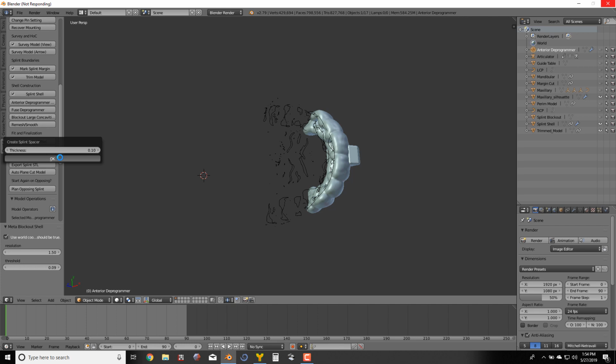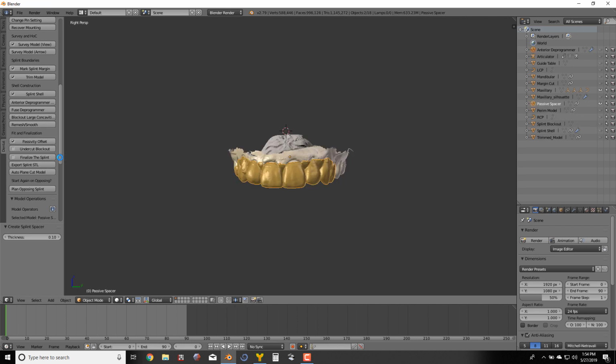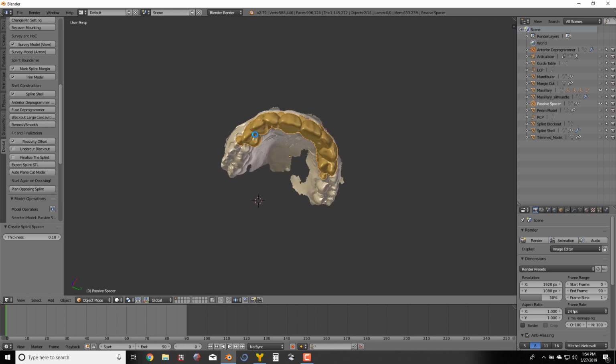But she has pretty good length of teeth, so I'm just going to leave it where it's at. But yeah, if you're going to be using this software, don't have Mesh Mixer open or Blue Sky Plan open at the same time unless you have a beast of a computer. Heck, I'm running this on a pretty high-end gamer laptop, and it still can take a little bit.